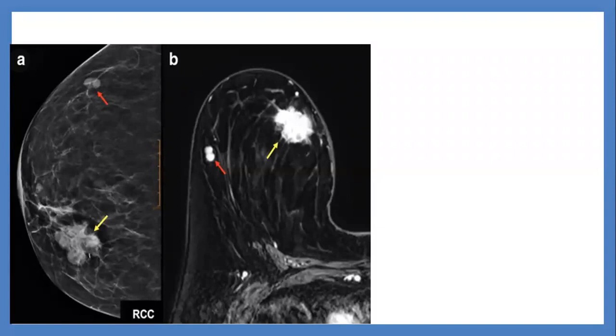Okay, this mass has adjacent architectural distortion, and this mass showed intense homogeneous enhancement at MRI.